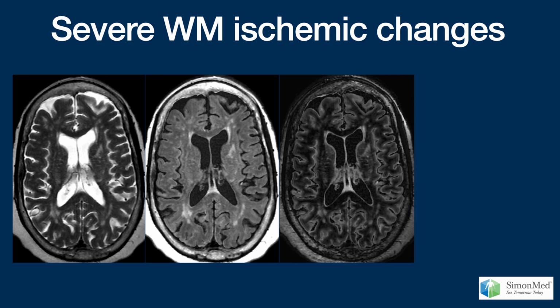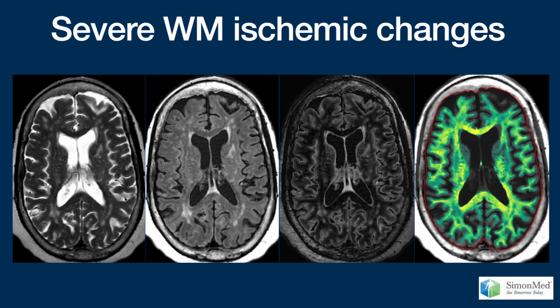When you are reading a case in clinical practice, the images won't come with arrows, at least not in 2021. In this series of slides, decide what you think of the lesions on the T2, FLAIR and DIR, and then see how they compare on the myelin image.